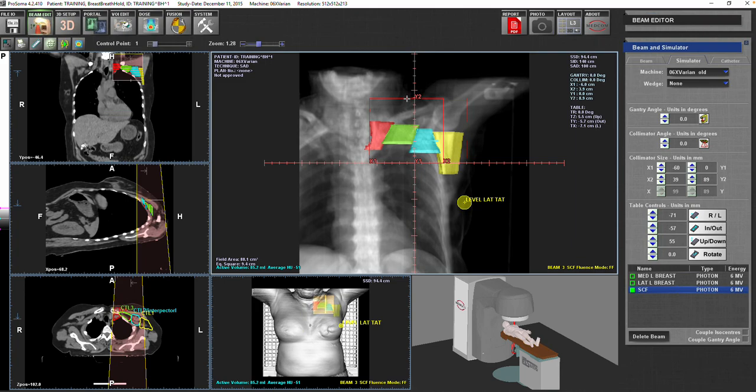The last border would be the upper border. You have one of two ways of doing things. It's either that you work ESTRO-based, which is talking about the CTV being the upper border of the subclavian artery.